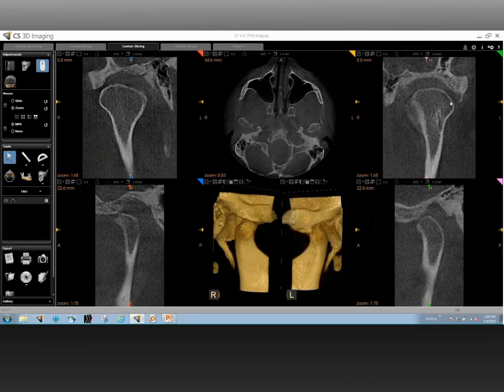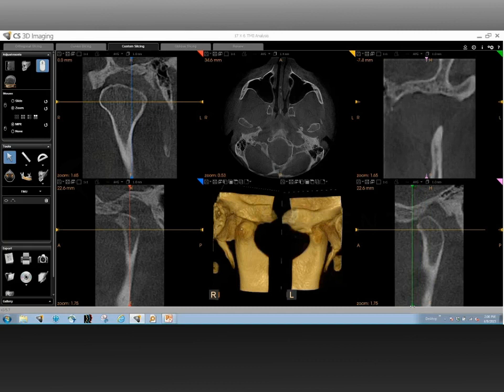Now, in this case, you can see the condylar head, and the cortical bone is not even that pronounced. And then you can look at the smoothness of the shape of the cortical bone by itself. Let me just go ahead and take a look at that particular anatomical region, all the way from the medial head to the lateral head. So what we're doing is going through the scan, and we are trying to see if we can notice any changes in the shape of the condylar head.